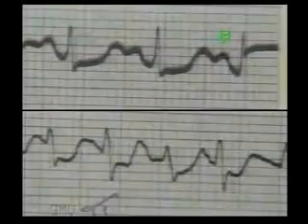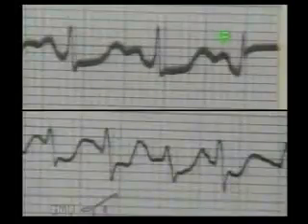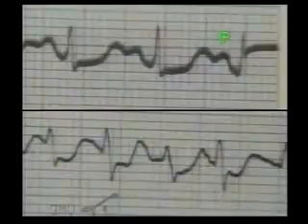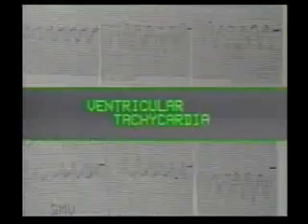In this ECG, P waves are difficult to identify in the lower lead. But you should observe all the leads carefully for P waves. Though they overlap with T waves, usually in at least one of the leads it is possible to identify P waves. Note how prominent they are seen in another lead in the same patient.